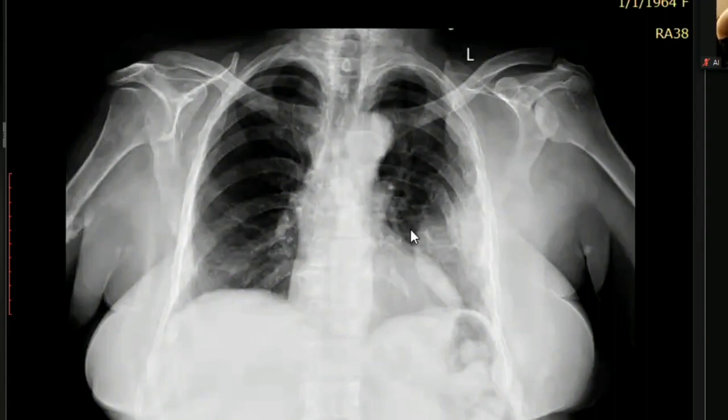And then again, fair enough, the lytic areas are there, no one can deny, but there is something else as well. So you will describe that there is some soft tissue mass or soft tissue haziness or whatever you want to say in the left lower hemithorax, but I cannot see the ribs, so maybe the ribs are involved, and I can also see some fractures.